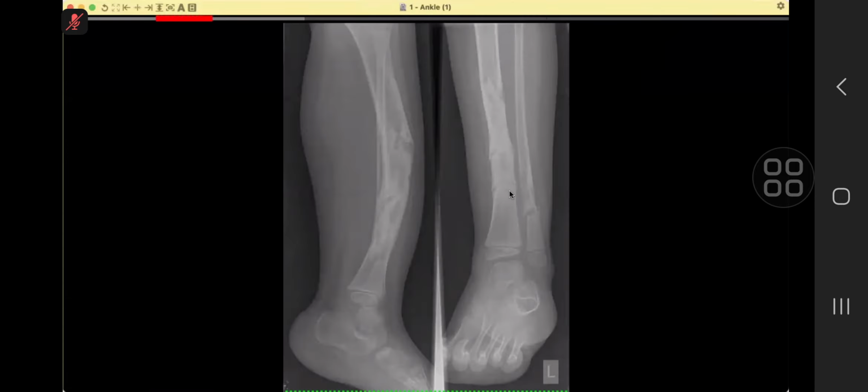Now, this is after 3 years, you can see fractures developing. I did not show you, but initially it was managed, I think till the age of 7, 8, 10, they tried to manage, but ultimately they could not. So that is NF1.